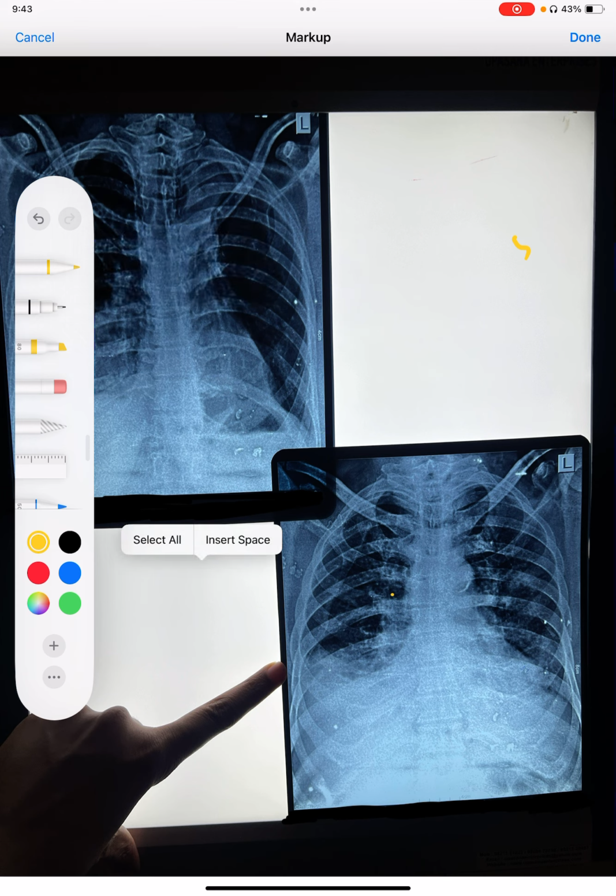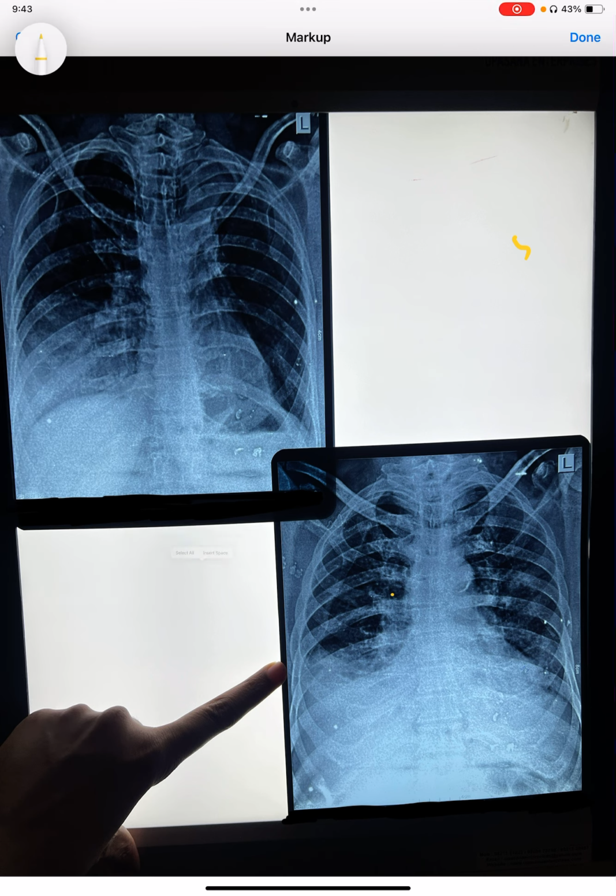Now, this is a very interesting X-ray comparison where we can see there are two X-rays. Both the X-rays are in PA view. So, in this first X-ray, we have a very beautiful comparison. This is the left side, this is the right side, and we see this is the costal angle, this is overall a diaphragm, this is the area of diaphragm, this is the area of diaphragm.